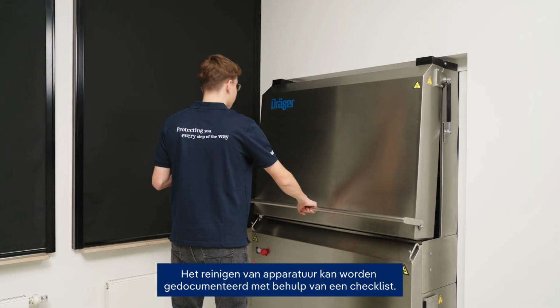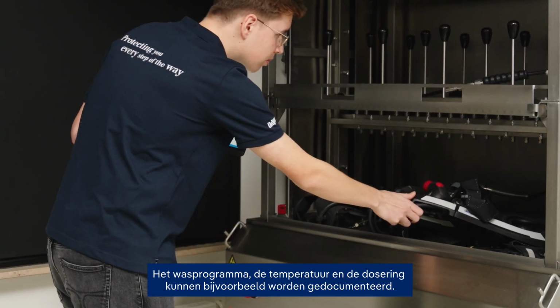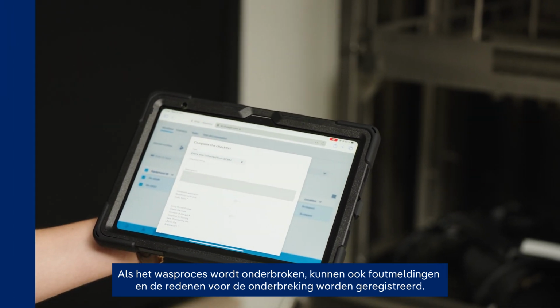Equipment cleaning can be documented using a checklist. For example, the wash program, temperature, and dosage can be documented. If the washing process is interrupted, error messages and the reasons for the interruption can also be recorded.